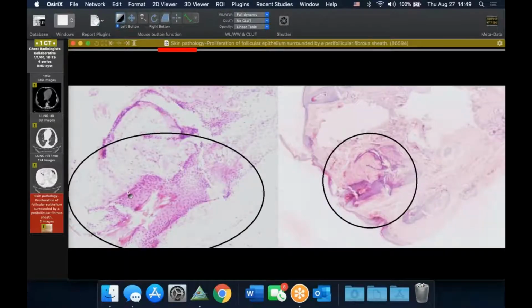And lung biopsies, I can sort of slog my way through. Skin biopsies, I cannot. But clearly this looks like some kind of abnormal squamous epithelium here, but this is what a fibrofolliculoma looks like, and you can see this sort of thickened squamous tissue there. So the pathology in this case, they were able to confirm a diagnosis based on a skin biopsy and a CT scan that's very consistent with Birt-Hogg-Dubé without the need for genetic testing.